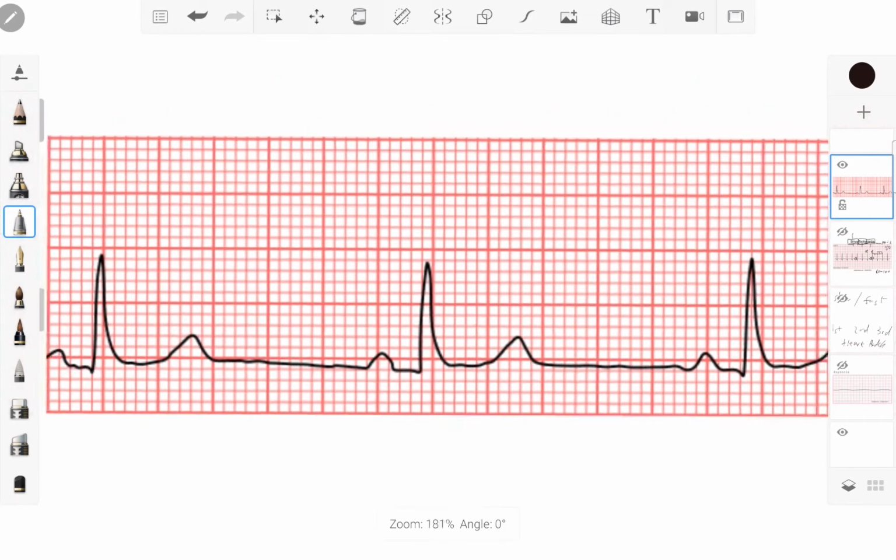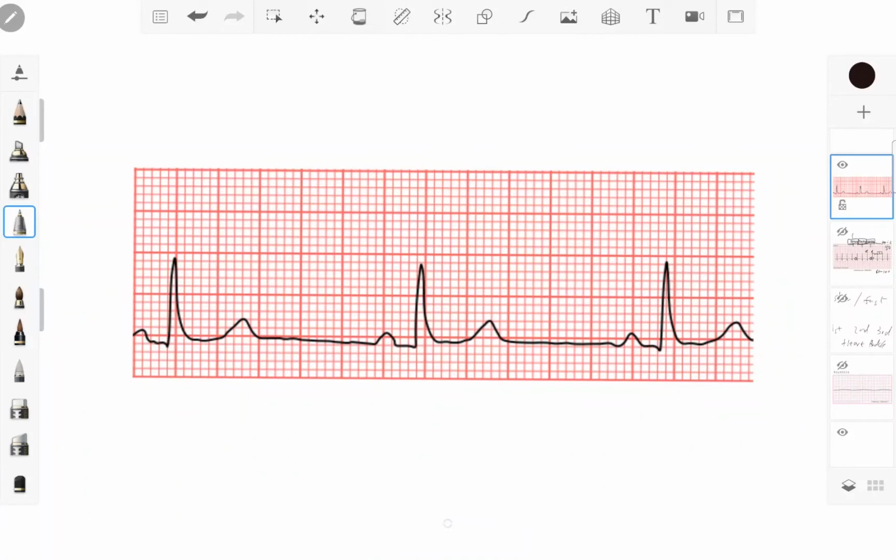Alrighty, let's look at this rhythm. It's not written there, so it's not obvious. What do you guys think? So let's see, our P wave is normal, our QRS is less than 3 little blocks, and our T wave is within halfway. So we're cool with that. So what is the problem here? Well, it looks pretty slow.